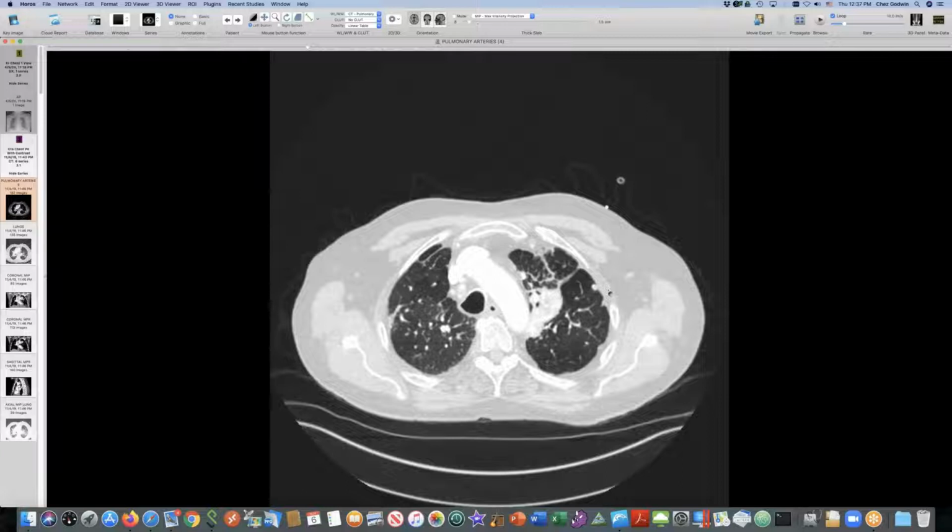Interesting. And I think the paraesophageal node business is also something to keep an eye on. I don't think anybody's written about that, but it makes a lot of sense in terms of swallowed material, swallowed dust, then getting into lymphatics from the esophagus and into those nodes.